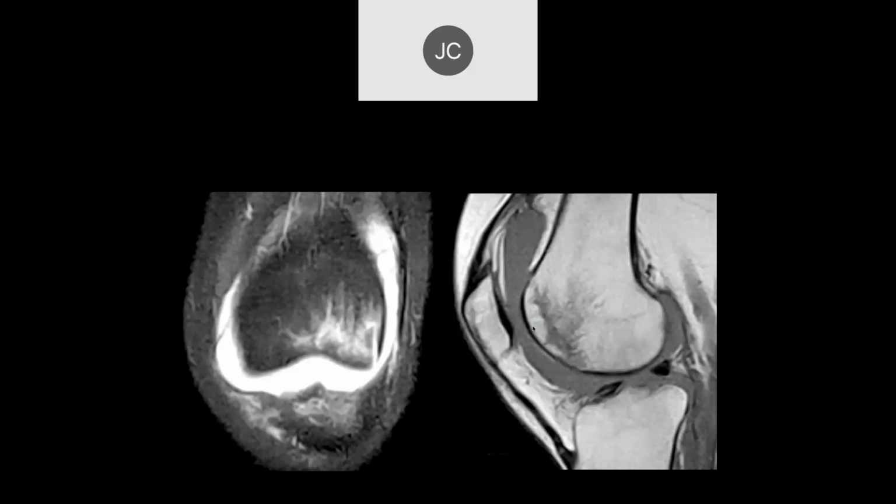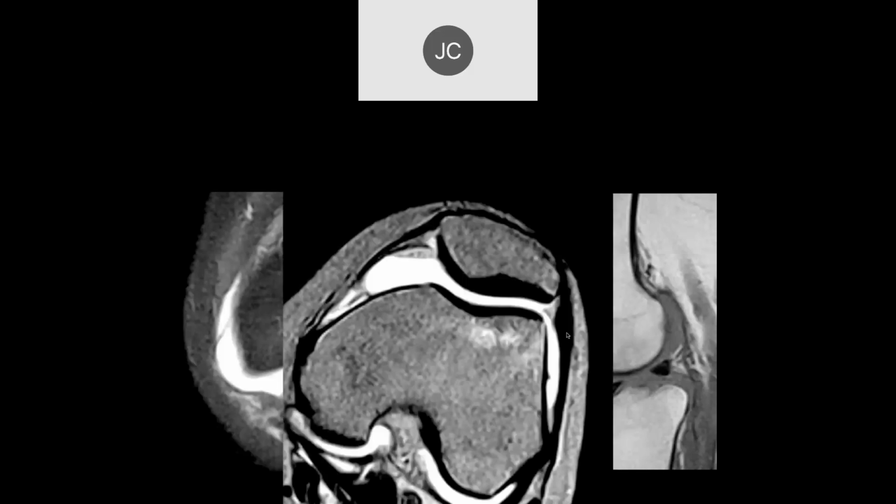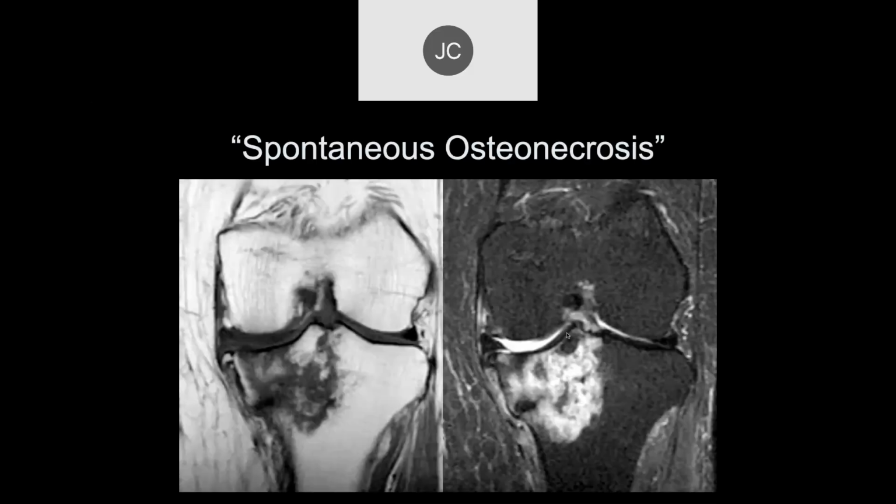Looking at the lateral femoral condyle, there's a lot of edema, maybe a subchondral fracture there as well. Yep. And this patient fell on their knees and had a direct impaction injury. Okay, so this is a patient who came in with a history of spontaneous osteonecrosis.